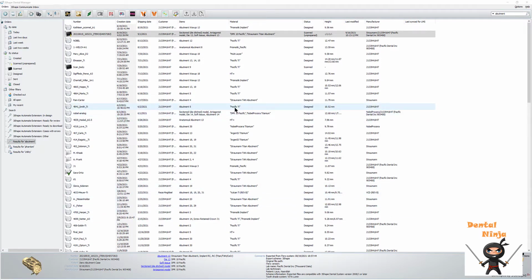There was a common question over the past few weeks or months about implant scans and how they're processed, and why there's a little piece left over. So I'm gonna do a quick run through for you. This is the iTero case that I got, imported it in. I already have it all selected.